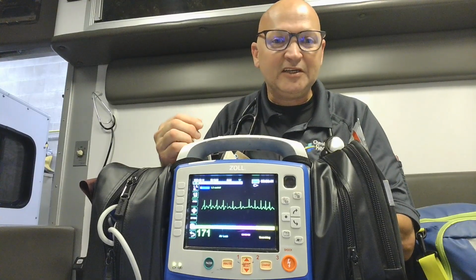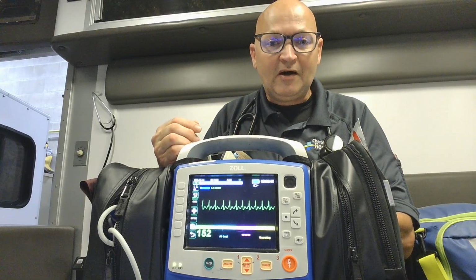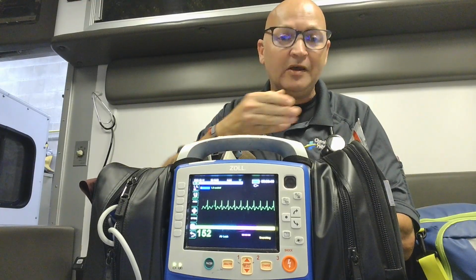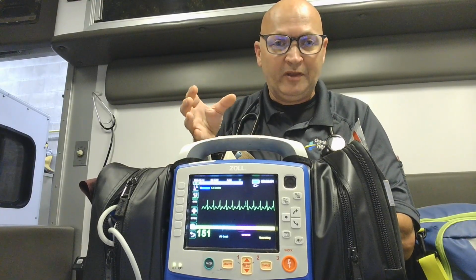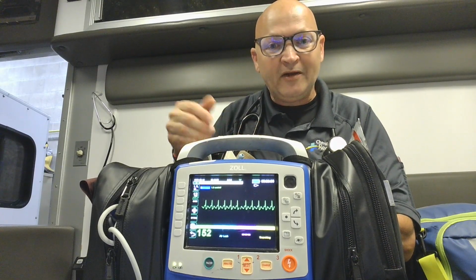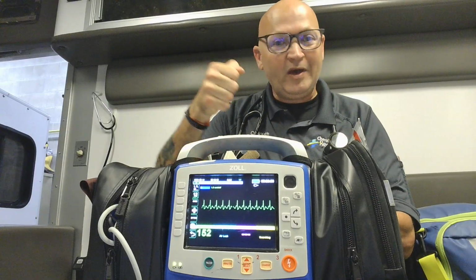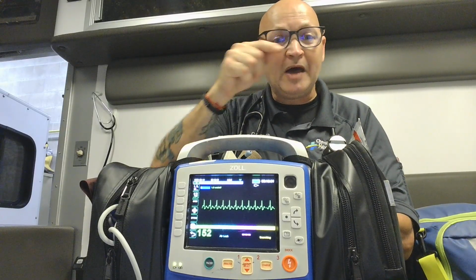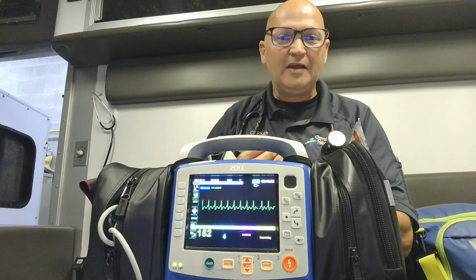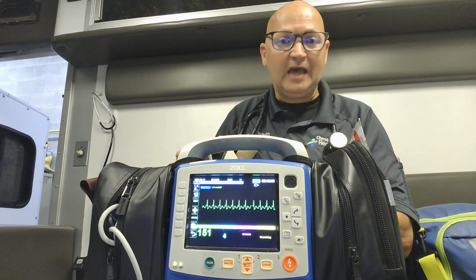Another rhythm, which is kind of a sister to AFib, is known as A flutter. Remember, AFib is irregular, while A flutter is more of a regular rhythm. What's cool about it is the pattern, which looks like a saw. If you took an old hand saw and turned it upside down, this is what the pattern looks like. A lot of these patients will have palpitations, a fluttering of their heart, and this is known as A flutter.